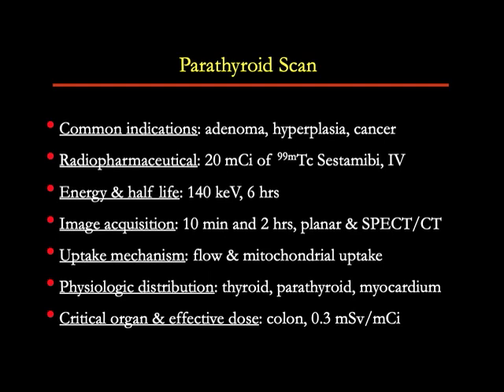There is physiologic activity seen in the thyroid gland. There is focal increased uptake seen in the parathyroid adenomas, and since sestamibi is a myocardial perfusion tracer as well, we see myocardial uptake, especially in the images of the chest. The critical organ for this radiopharmaceutical is the colon.